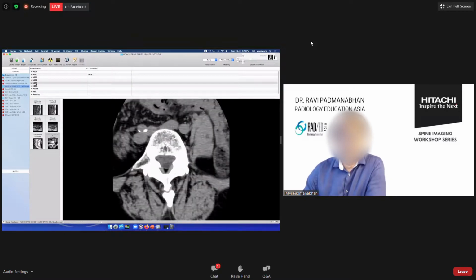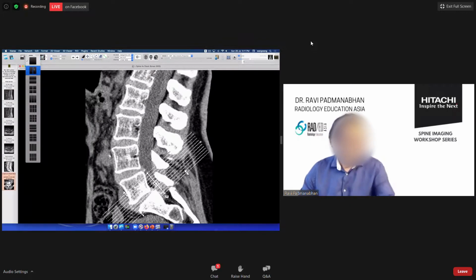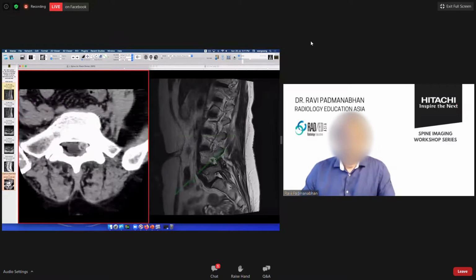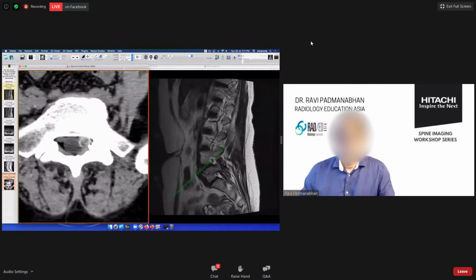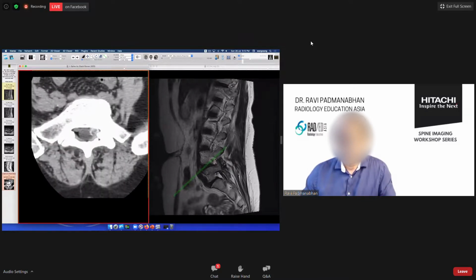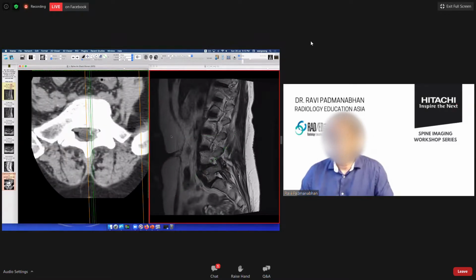Okay, so this is the one where we have calcification of the cyst. Let's look at the CT first. So here's the calcification. What's important on CT? One is that it's rounded. We have calcification. It's sitting up adjacent to the facet joint. It's in the subarticular lateral recess. And we'll have compression of that traversing nerve root. Let's look at it on the MR.